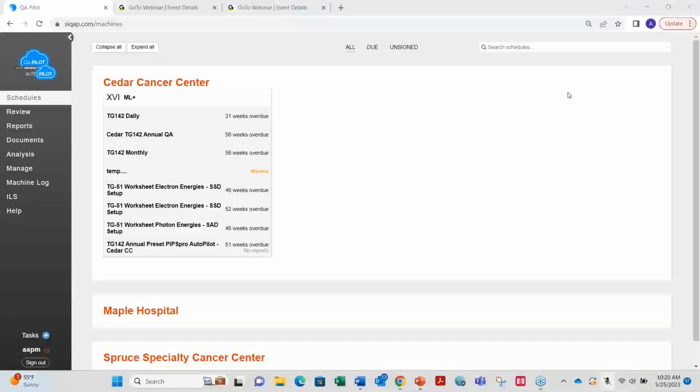But when you're building a report or you're building trending, you have to build that every time you're doing it. Here, everything is automatically done for you. And in fact, you can view trending even from this first dashboard, if you will. You don't have to build it. Your report is right here. When you go to review, the summary is there.